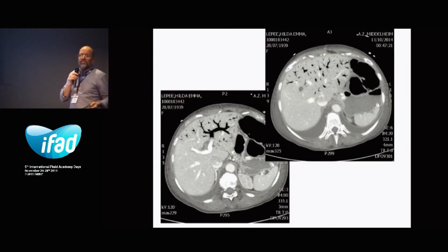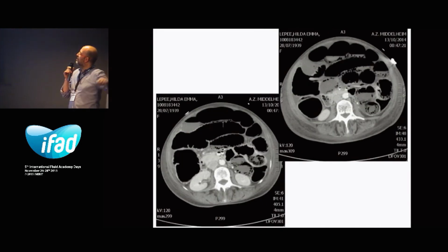And, well, I did a CT scan, of course, because I can only see with the ultrasound there's a very critical problem going on. I had a lot of air in the liver coming from the vena porta. You see air in the portal veins with a very sick abdominal intestinal system, and it's extreme ischemia, and this patient, of course, died. But then you have a diagnosis. Okay.